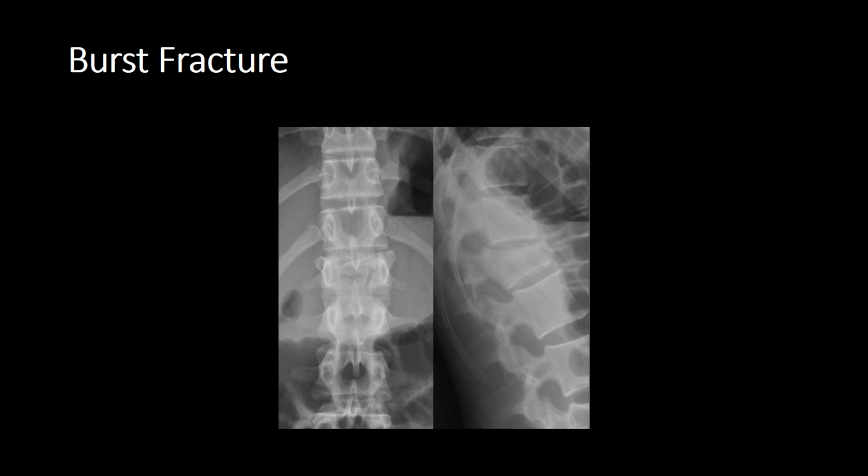I appreciate on these images it's not great. If you look along here, this is the superior vertebral end plate of T12, this is the superior vertebral end plate of L2, and we can see this sclerotic line indicating the depression of the superior vertebral end plate of L1. And if you take it from me, this lucent line is our horizontal fracture.